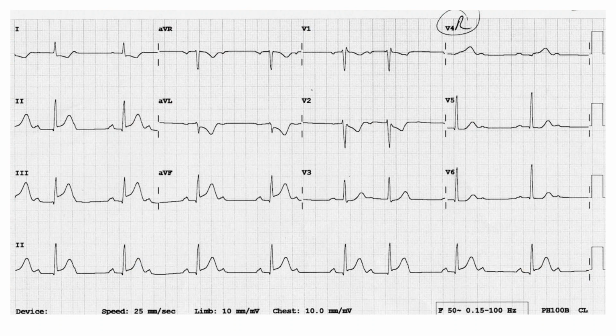Now, what is this? You can see that there is a P wave here, here, here, here, here, here, and here also. So from this you can understand the atrial rate. First of all, we will see what is the atrial rate, then we'll see what is the ventricular rate. Atrial rate comes from the P wave intervals.